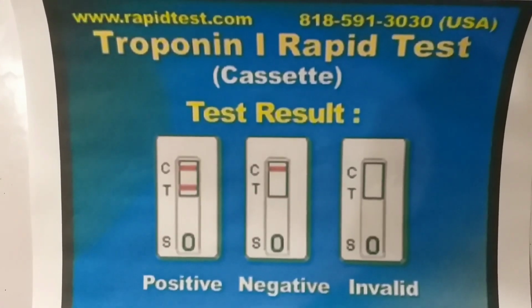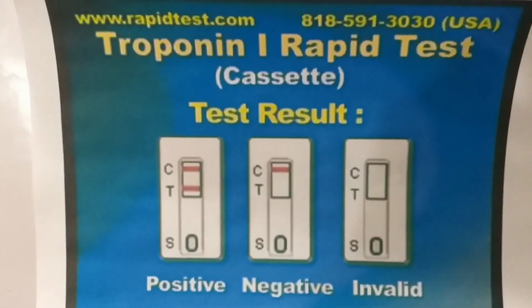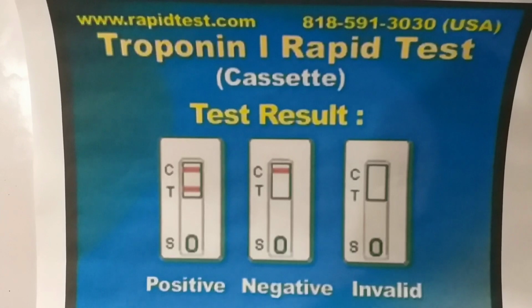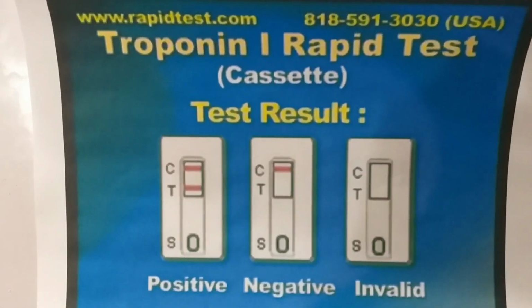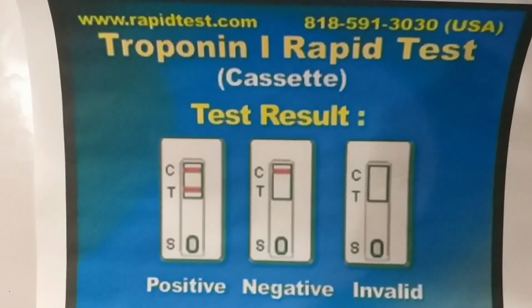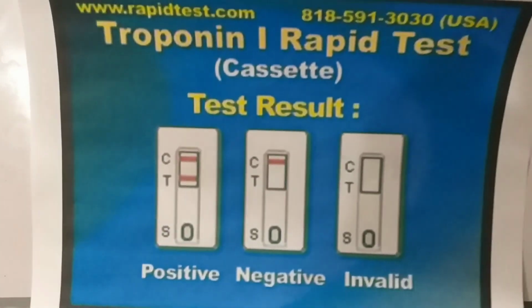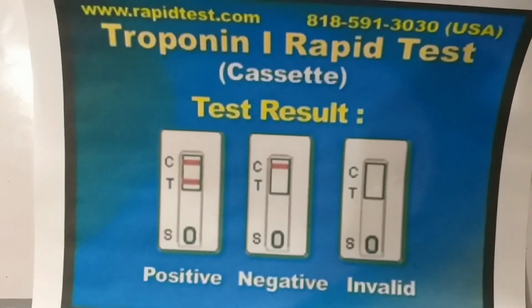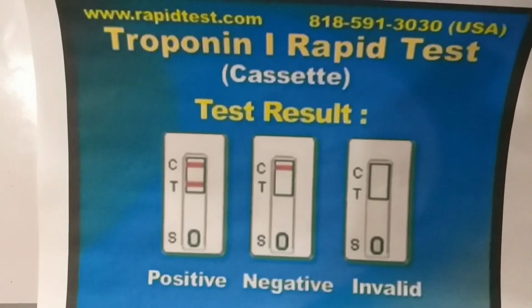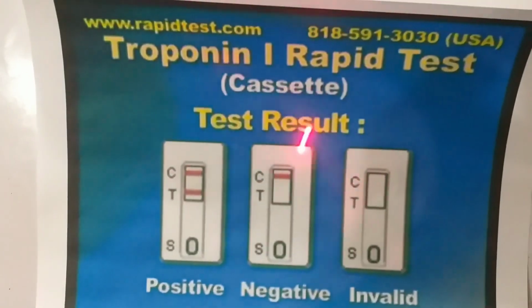There are two types of troponin, I and T. Troponin T is non-specific because it is also positive in cases of sepsis, ARDS, chronic kidney disease, surgery, DIC, disseminated intravascular coagulation, pregnancy, or trauma. But troponin I is very cardiac specific. But when you are in doubt, like if the patient has comorbidities, it is better to get another set for the quantitative result. But here you see the qualitative test, this is a troponin I rapid test.